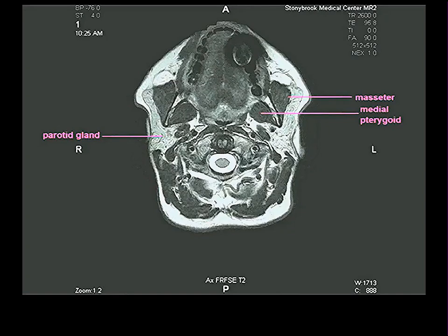Here's the parotid gland on the left side. Here's the parotid gland, a big one too, on this person's right side. Maybe I can see a retromandibular vein or external carotid artery, but I can't really identify them. But parotid glands look very different than muscles on MRI.